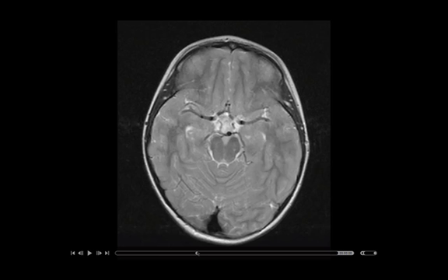This particular image here is best looking at the midbrain and the circle of Willis. Let's start with the midbrain. This structure here that kind of looks more like a Mickey Mouse is the midbrain. The ears of the Mickey Mouse are the cerebral peduncles. This whole structure here is the midbrain.